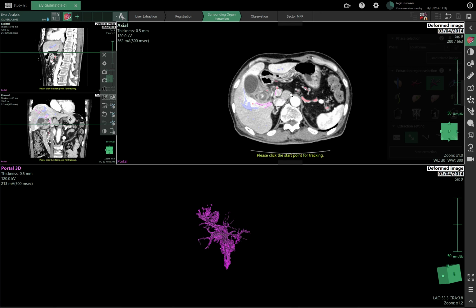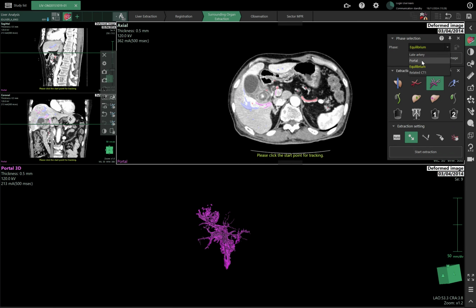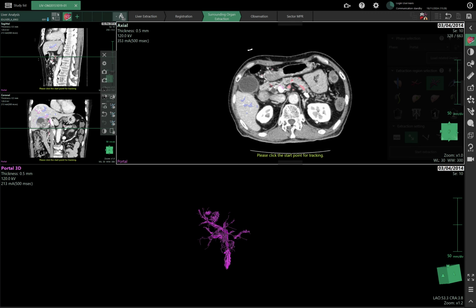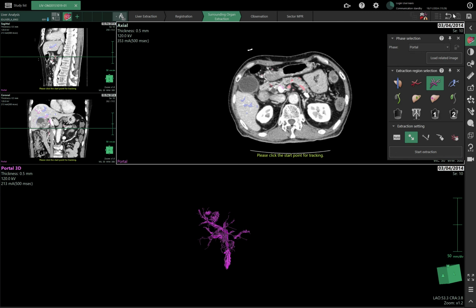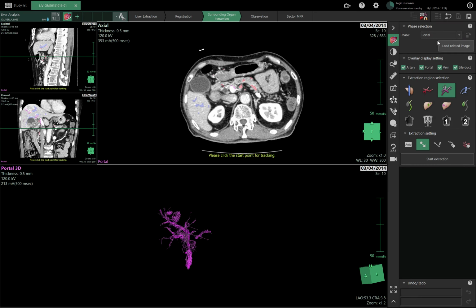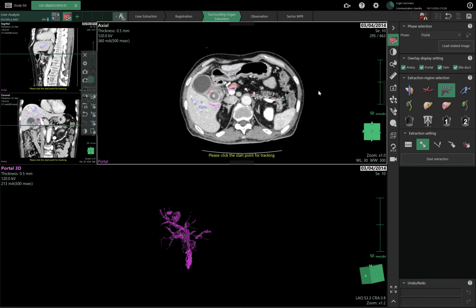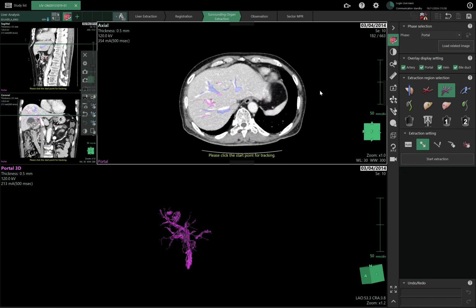No, I mismatched the series, don't worry. So here in this case, I will switch to portal maybe. Oh yes, here, sure. Yes, so let's go to the portal.